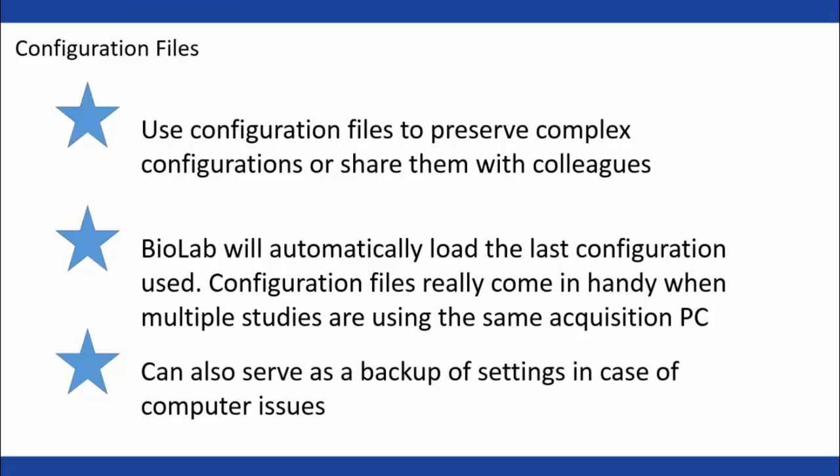And another use case for configuration files would be a backup. So if you're having computer issues, hard drives sometimes fail. Things happen. And if you were to have saved your configuration into a configuration file and backed it up somewhere else, then when this sort of unfortunate event happens, you can reload BioLab, load your configuration, and you're right back to where you were without having the time-consuming process of reconfiguring or even remembering the specifics of your configuration from last time.